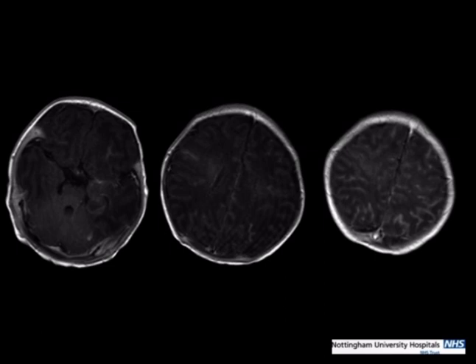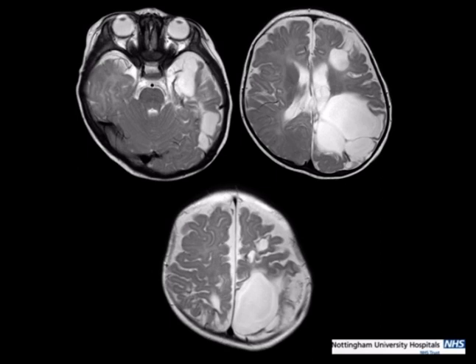And if you don't raise it, and if the clinicians aren't thinking of it, the patient doesn't get treated for it. And even with treatment, I'll just show you this one as well, it doesn't enhance fantastically, herpes simplex. There's possibly a bit of increased cortical leptomeningeal enhancement around there, but the actual brain parenchyma doesn't tend to enhance unless it's broken down or become hemorrhagic.